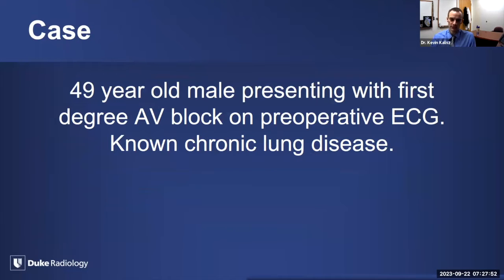Next, 49-year-old male presenting with first-degree AV block on a preoperative EKG, and he has known chronic lung disease.